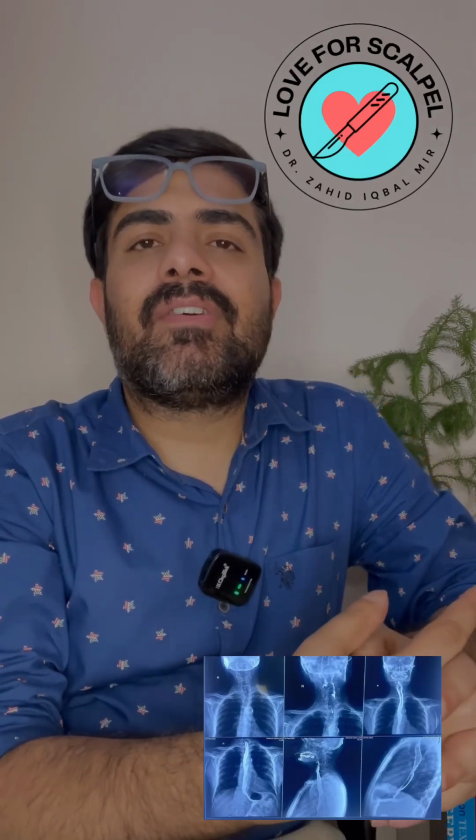One more thing, we should know the anatomical landmarks on barium swallow. The cervical esophagus is from the cricoid cartilage, at the level of C6, up to the thoracic inlet, that is T1 to T2. Then the upper third of the thoracic esophagus is from the thoracic inlet to around T4, and the mid esophagus is from T4 to T7. That is the level of the carina and lower border of the azygous vein. Then the lower esophagus is below T7 down to the GE junction, at T10 to T11. It is just above the diaphragm.